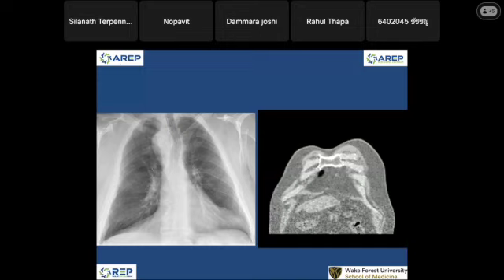Is it noticeable here? If I said it's an annual checkup, it means the patient does not have symptoms, so not likely to be pulmonary edema. Sometimes we can make a normal lung look like pulmonary edema by adjusting the exposure on our workstation easily. So no symptoms, so no pulmonary edema. Okay, big heart.